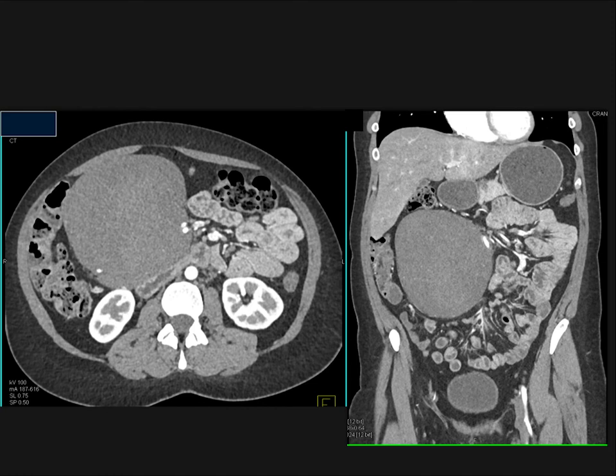I could go with lymphoma, but one solid mass lymphoma and seeing nothing else, I'd have a problem with that. But you can get big mesenteric masses with lymphoma, but I'm just not that excited. Is this a hematoma? Well, it's not high density. It's not low density. It's large, right in the mesentery, has mass effect. I would not consider hematoma. To me, this is a solid tumor. The other possibility is a desmoid tumor, fibromatosis.